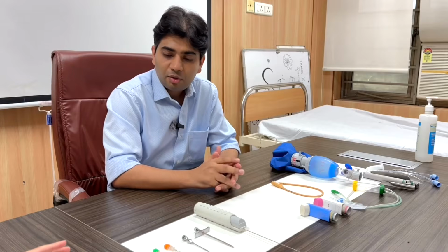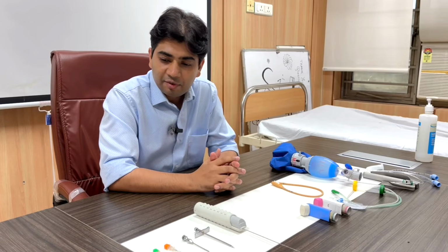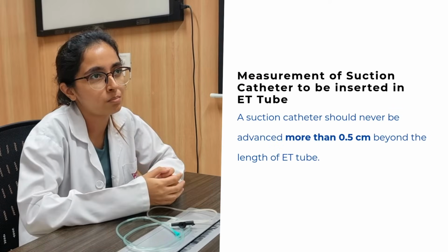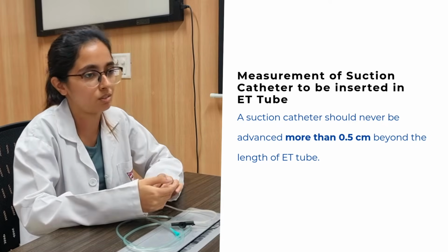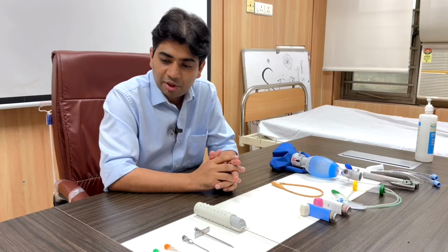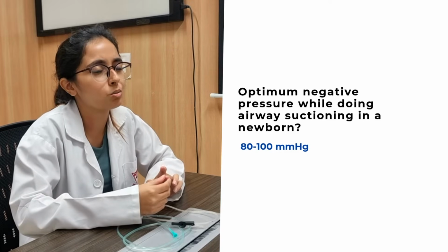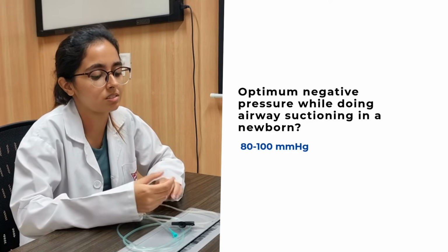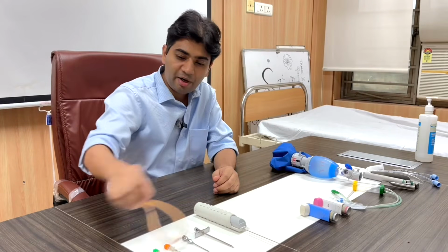Right. So how do you determine what length of the catheter needs to be inserted when you are doing an ET suction? So it basically should not be more than 0.5 centimeter beyond the length of the ET tube itself. Okay, and what should be the pressure that we should keep when we are doing a neonatal endotracheal tube suctioning? So a pressure of 80 to 100 mm of Hg is preferred when we are doing it. Right. Identify this.